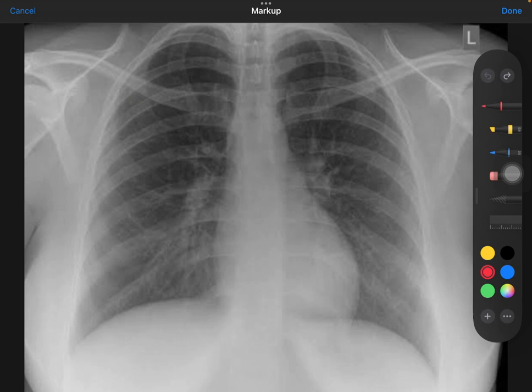Then we come a little bit inside. We see the cardiophrenic angles. The left cardiophrenic angle, this is the right cardiophrenic angle. Now the mediastinal structures that we see are mostly formed by the heart and the vessels, the aorta and the pulmonary trunk, and here the trachea.